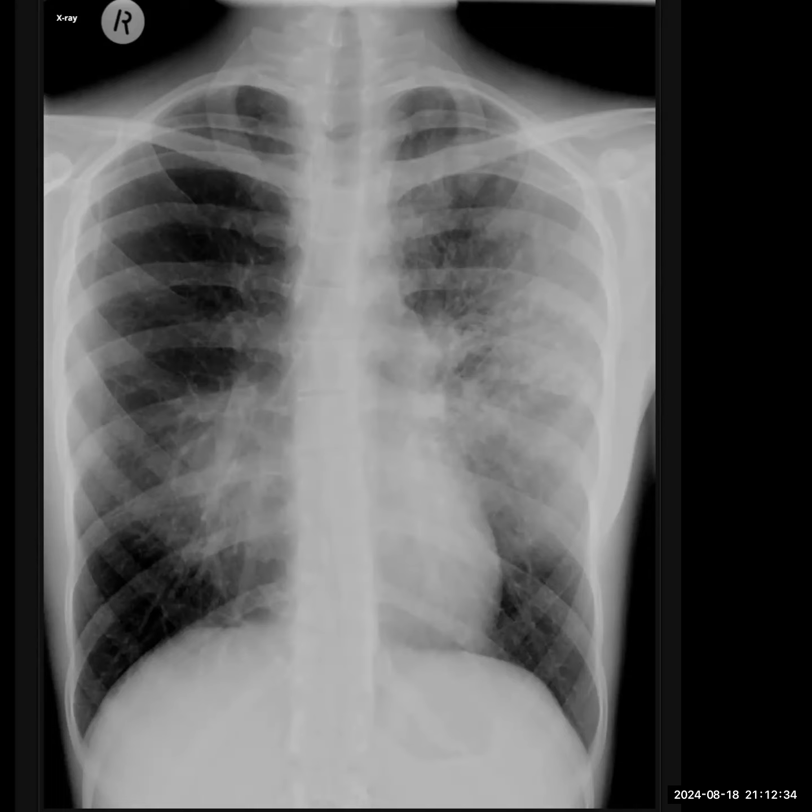I'm trying to look at other areas, and the apices appear normal. I'm sorry, the right apex appears normal. The left also appears normal. I'm trying to look at any other areas. The visualized abdomen appears normal. There is no evidence of any pneumothorax. There is no evidence of pneumomediastinum. So with this kind of history, I'll be thinking in terms of infective etiology.